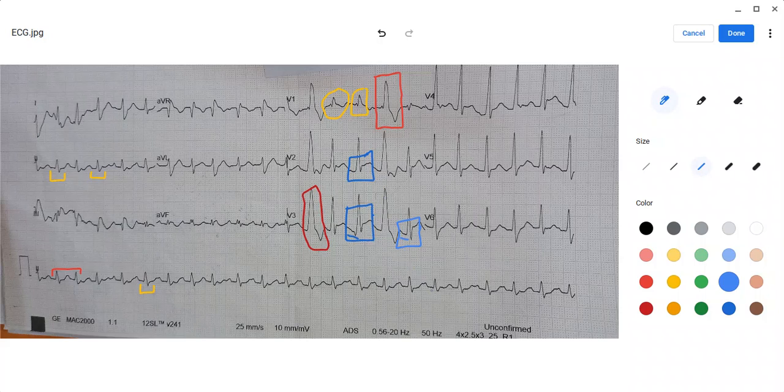So in the anterior leads, ST segment elevation is visible. Definitely this patient has myocardial infarction, which was later proved on coronary angiography performed on him, and multiple blocks were present. Also, right bundle branch block may sometimes be associated with myocardial infarction. And given the classical presentation of the patient, we always need to rule out myocardial infarction. So this is not a very simple ECG. It is a complicated ECG because so many findings are present, and a closer look is required, especially when the patient has classical symptoms of myocardial infarction.